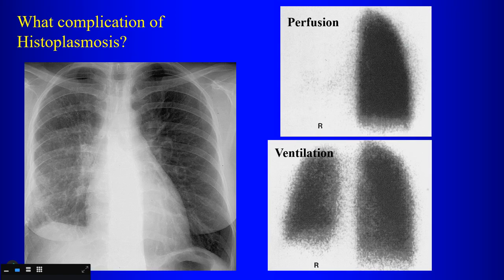Or can you make the diagnosis on the chest radiograph and the perfusion scan? These guys did. I mean, with the perfusion alone, you're going to see PE, right? If you see the perfusion alone and you see the opacification on the side. Okay, so you have a chest radiograph that shows unilateral abnormalities. You have a perfusion scan that shows that the right pulmonary artery is not being perfused at all.